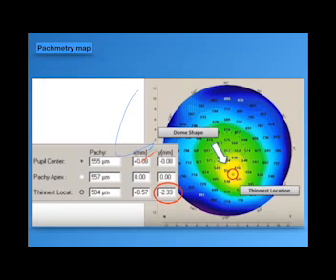So there are four factors: the difference between the elevation, the difference between the thickness, the steepest K, and the other factors. Otherwise normal eyes should be close to each other. It shouldn't exceed the accepted range, otherwise you will discuss.